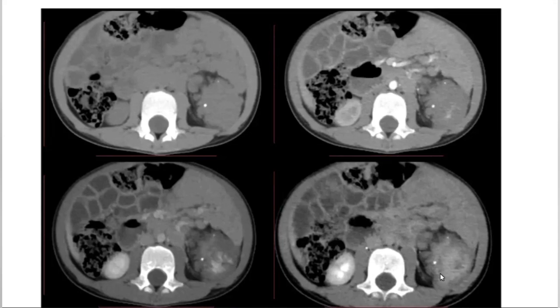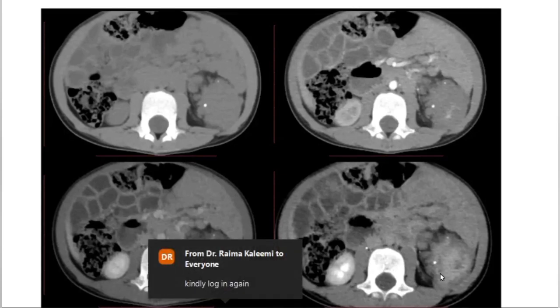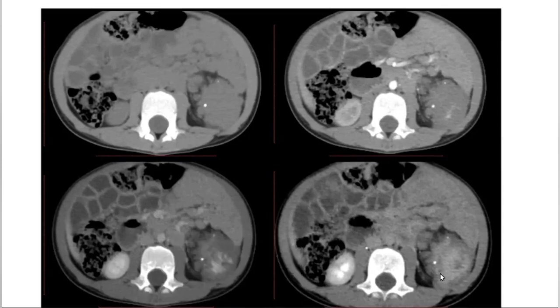Perhaps if I show you this lesion in the subcutaneous soft tissues, you'll quickly pick it up. But there are a couple of films in the exams which are very surprising for everybody. So just to get your attention, this is a colonic hemangioma, and this patient got resected. He had a surgery, and the biopsy also coincided with our findings of hemangioma.